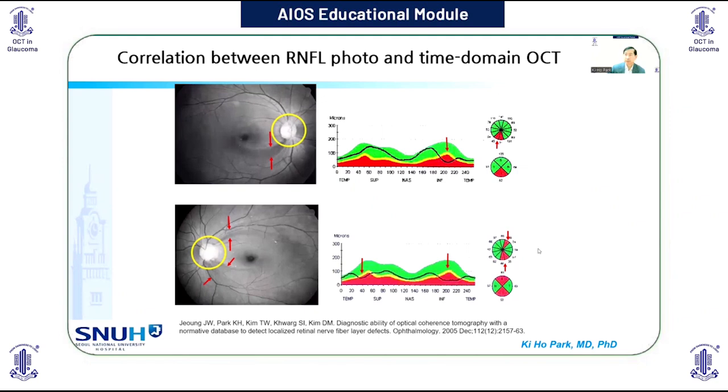plotwise deviation, color-coded deviation comparison diagram.